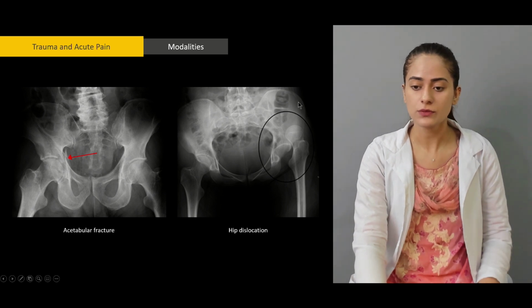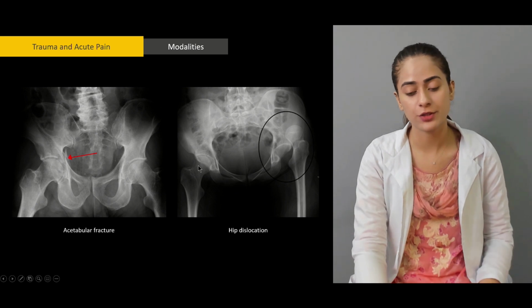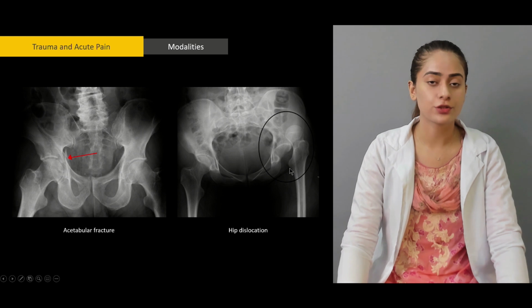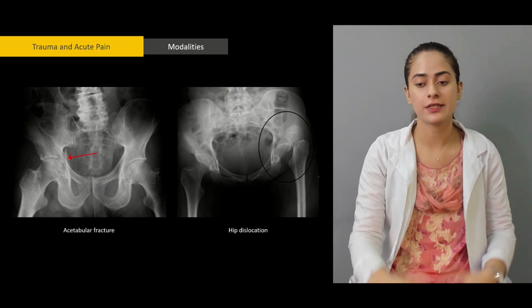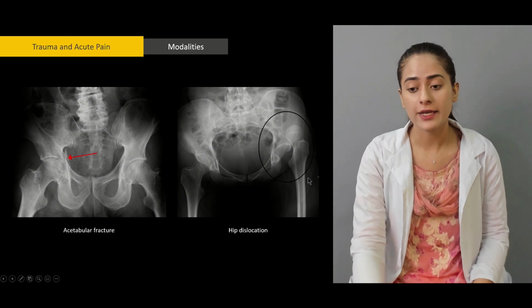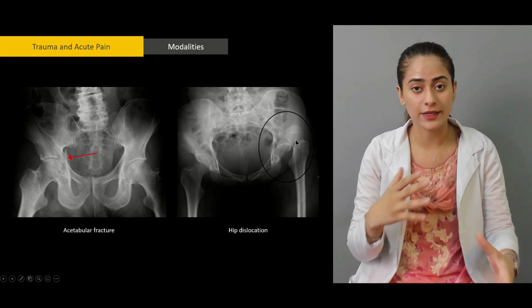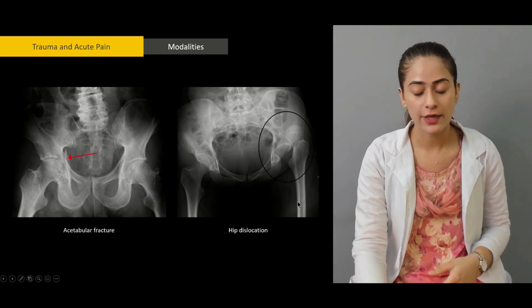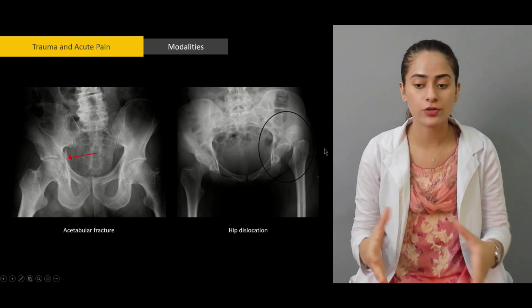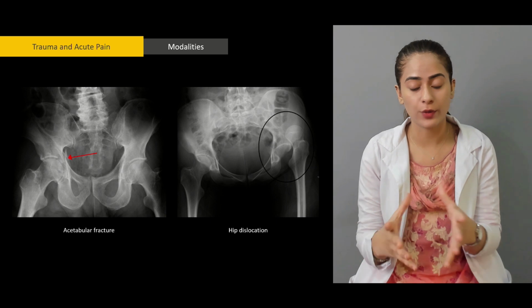So this is a displaced hip. Again, we have something to compare it with. When you compare this with this, it's very easy to pick up fractures or dislocations in the pelvis, and the major reason is because you have something to compare it with. Again, what will happen is there is going to be a leg length discrepancy, right? Because this has moved up, then this entire leg will be shorter, right? And it won't be able to bear any weight, so there will be no weight bearing.